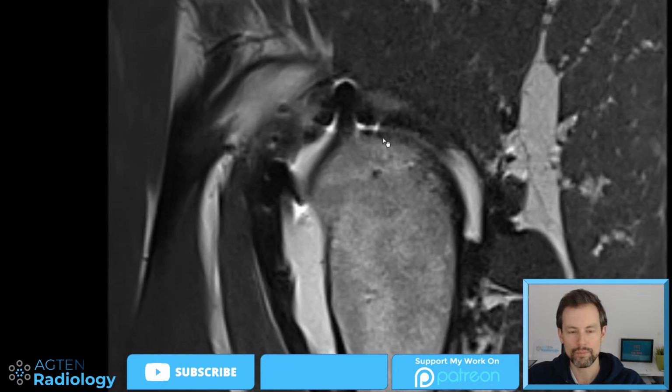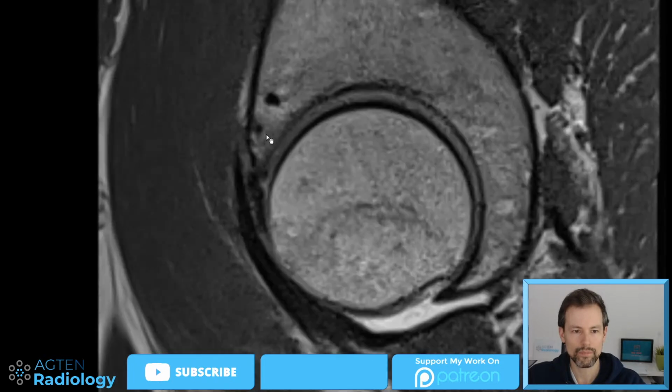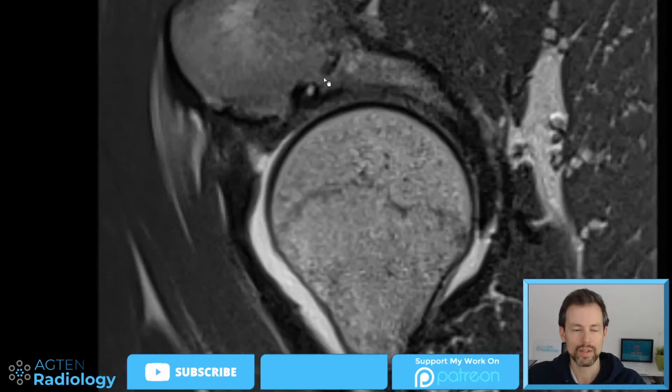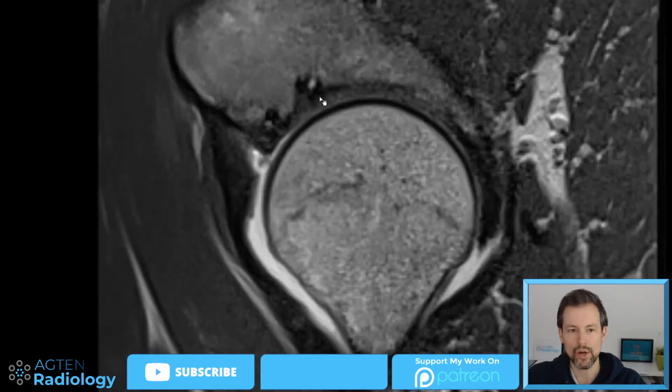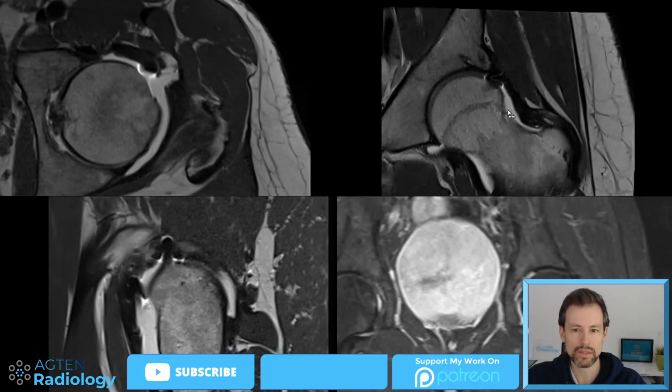I can't show you the radiograph, but the anchors this patient has, as you can see here, when they did the labrum refixation, there are several ones here. They are not metal anchors. And if you see this kind of artifact, you should definitely check your radiograph. And the radiograph was completely normal, no metal. And this is just abrasive change from the surgery. It must be some microscopic metal fragment that's causing this artifact. It's not a dislocated anchor.